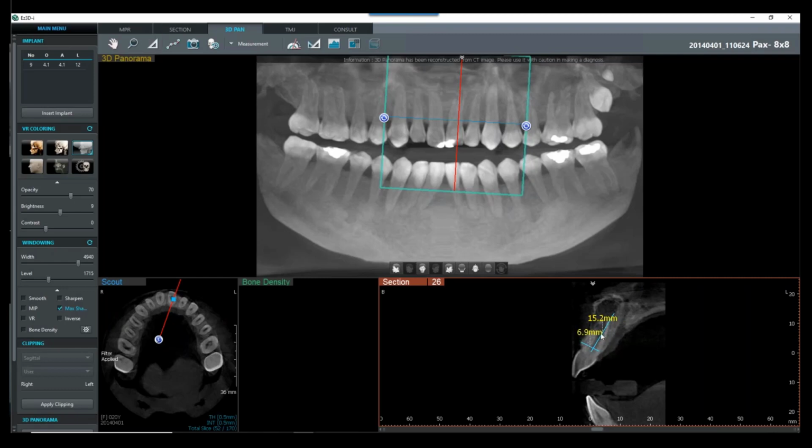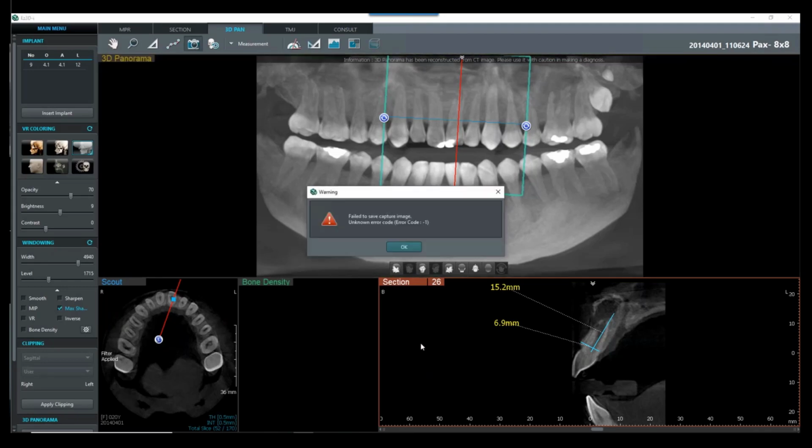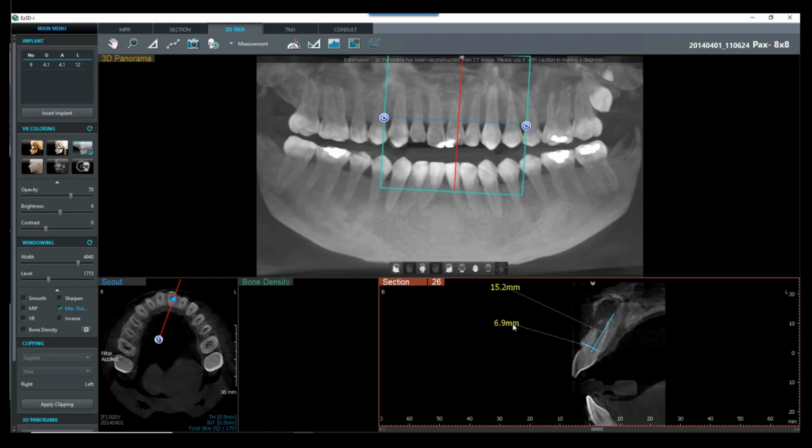And you can keep measuring until you want to turn your tool off and just do a right click to turn it off. So from there, we could take a screenshot if we want to capture those measurements with the camera up there. Usually it'll say save database there, but now we can just simply right click and hide our implants if you want, or delete them, either way.